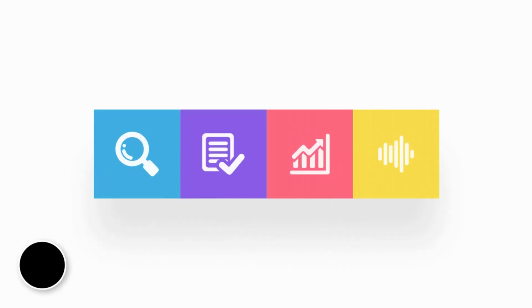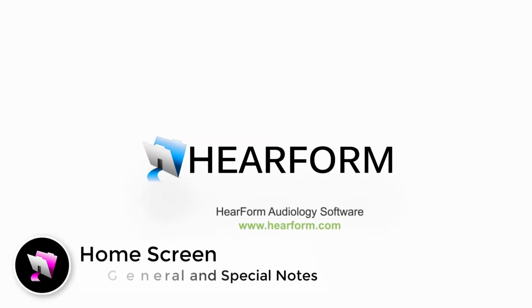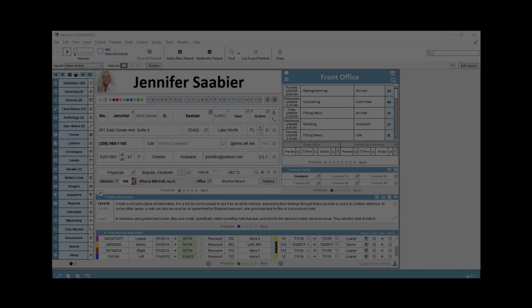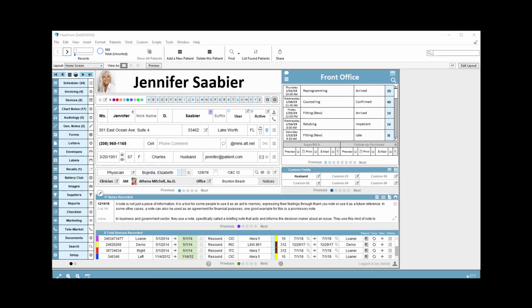Welcome back. This video will explain how to work with general and special notes on the HearForm home screen. There are a number of areas in HearForm Pro where you can store notes. You may have already seen a video regarding the standard notes section of the audiogram area and the SOAP notes.